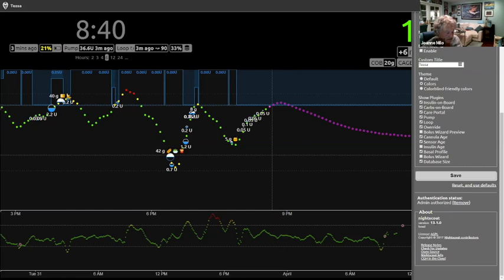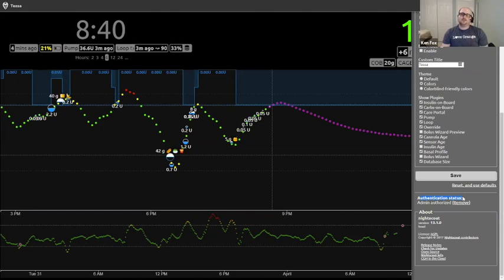Yeah, so if you look at the versions at the bottom, which is good, you also see just above that this authentication status. If you can't see the plus button, it'll show up here, and some other things, you need to be authenticated. So you have to enter what's called your API secret when you set up Nightscout. That's kind of like your site's password. Essentially, it lets you go in and change certain settings you couldn't change otherwise. So if you're not logged in on the device you're using, this will show you that you're not authorized.